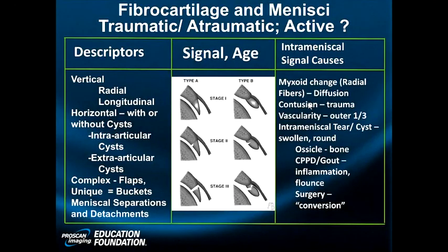But most important is the normal meniscal vascularity of the juvenile. If you call that a tear, you are creating a disaster for a child. Read meniscal tears in children very, very conservatively. In fact, if you're not a pediatric or an MSK radiologist, you should probably not even read them unless there's a discoid meniscus or unless it's just the most amazing, gross example of meniscal tear you've ever seen.